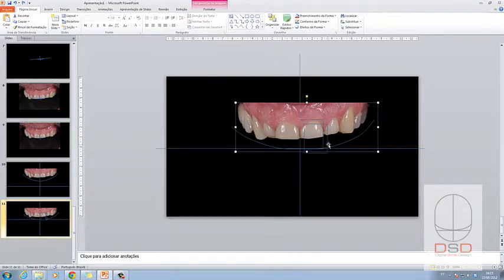Don't get the image like me, just click on the rectangle until you have it, and then here you can position right there. Okay, now we can see it's a really nice design, and we can start designing the tooth here.